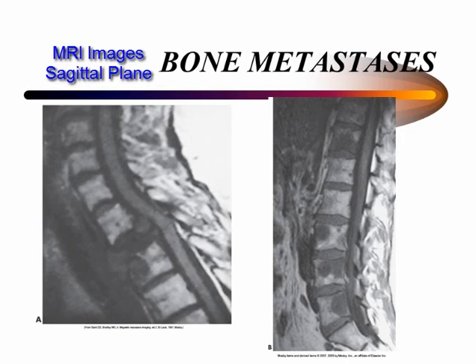These are both MRI images in the sagittal plane on patients with metastases. The image on the left is a sagittal image that shows gross metastatic destruction and replacement of the body of T2, which has collapsed. The metastases has a lower signal intensity than that of the vertebral marrow or the spinal cord. The spinal cord is focally indented and displaced posteriorly by the tumor. Also, a low signal intensity lytic metastases involves the anterior portion of T3.